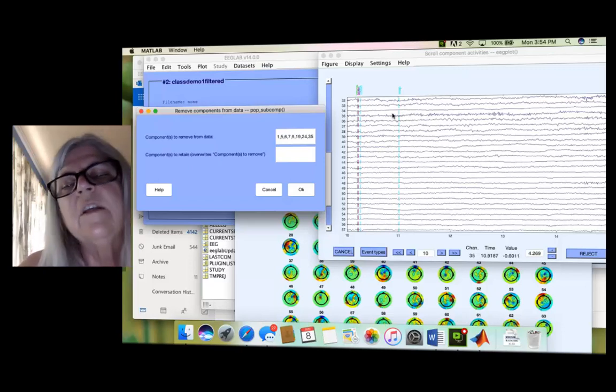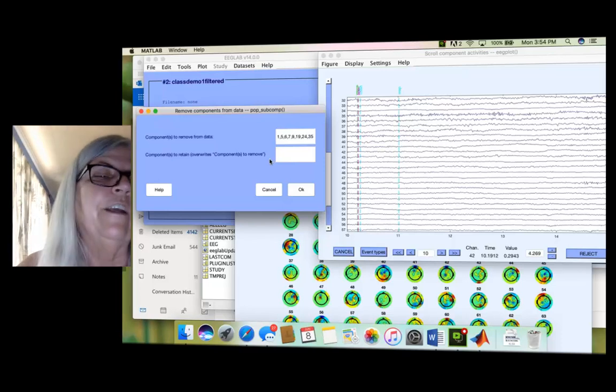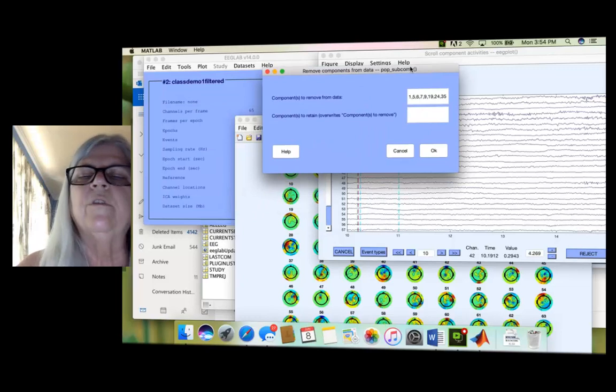Sometimes I kind of test myself and I'll go pick the ones from the figure that look off, and I'll go and pick them from the time plot and see if I agree. Just as a way to kind of, I don't know, sometimes you get bored when you analyze all the details.